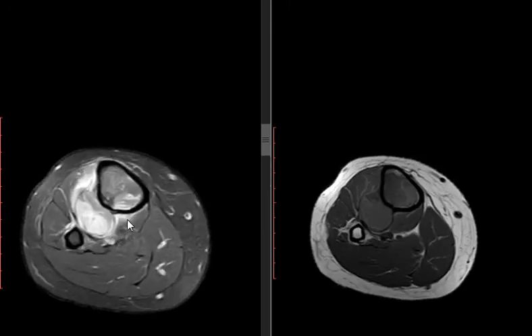What's your differential diagnosis for an 18-year-old female presenting with dull leg pain, where MRI shows an intraosseous mass of the tibia with a soft tissue component and possible encasement of the adjacent fibula? Notice everyone should answer at their own level, so don't show off. What would you put for an 18-year-old with a bone mass?